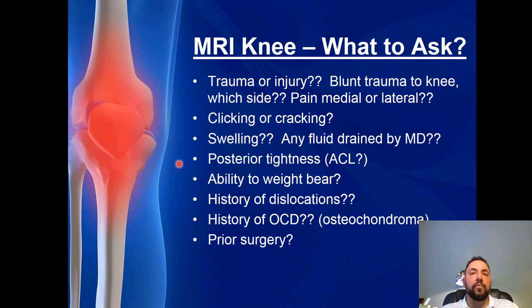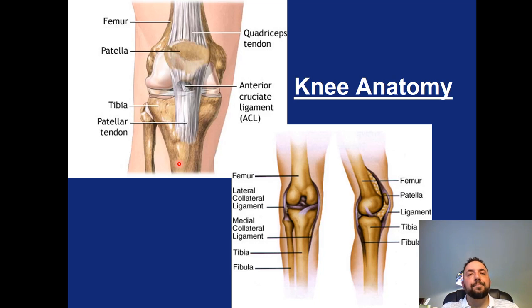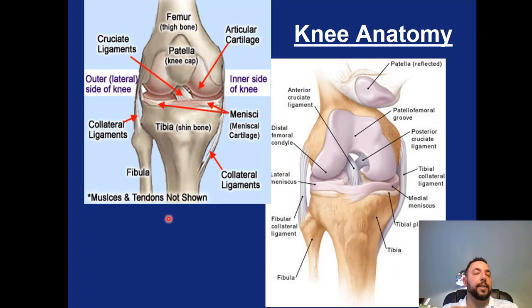We've talked about metal artifact reduction techniques. Very often in ACL surgery, they use metal to anchor their ACL to the bone, and that may require corrective techniques like a wide bandwidth, no fat sat, use STIR, and a very small slice thickness, high matrix to compensate for metal. So again, the cruciate ligaments are best seen on the sagittal plane, but the LCL and the MCL, the collateral ligaments, are always best seen on the coronal plane based on their positioning and how they articulate.